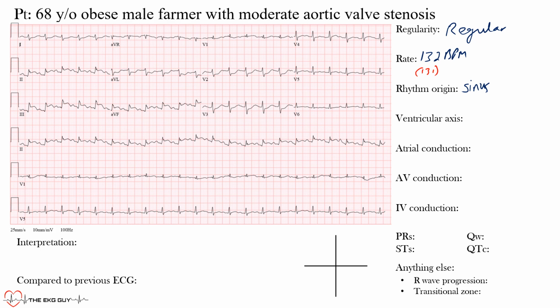Ventricular axis, I know some of you are wondering what we use here at Mayo. We tend to use negative 30 degrees and positive 110 degrees, meaning that this area here is considered normal ventricular axis. Remember, we talked about the P wave axis from the sinus node between 0 and positive 75. In the ventricles, it's a little different, okay? So that tends to be the normal axis. Let me just spread this one out a little more so it's a little more similar. So about that region there, okay?